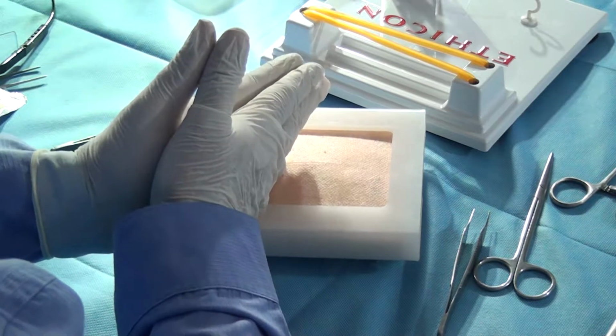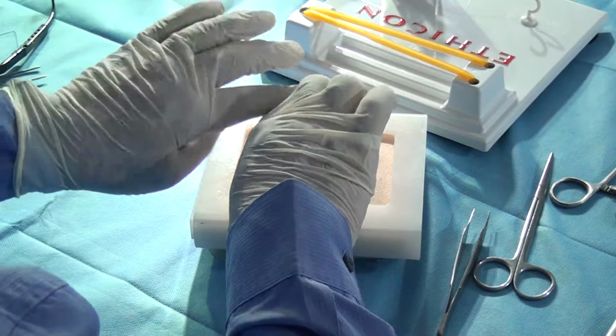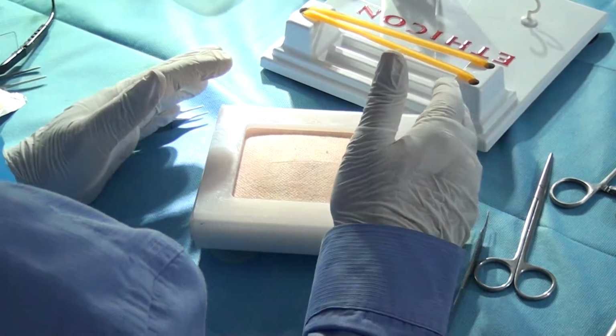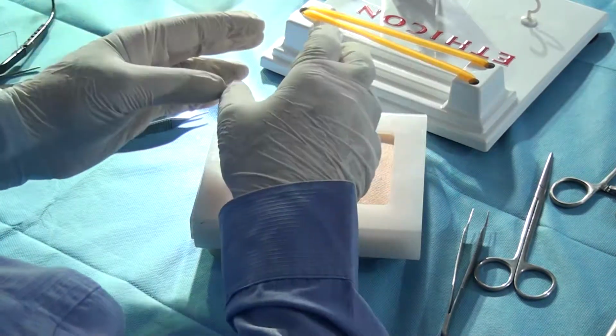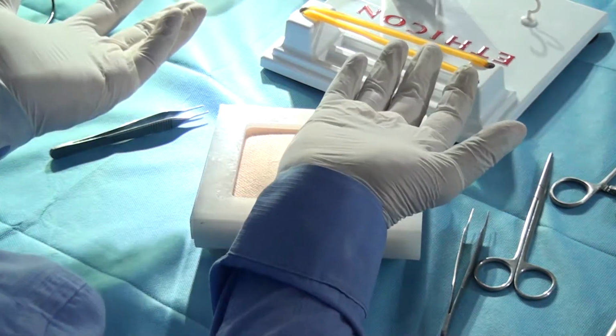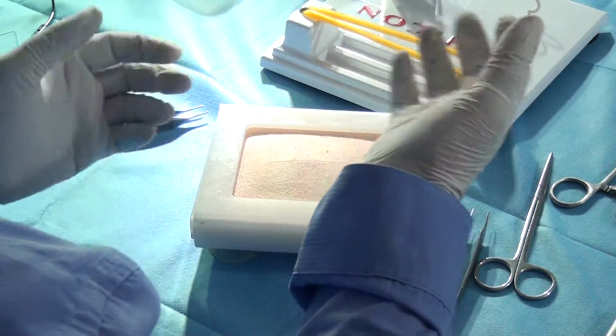Therefore, the table has to be at that level so that you can maneuver your wrist accordingly. And remember, I teach my students to do pronation and supination when they are doing nothing else. Therefore, tennis is a popular game among surgeons. Reason? Most of the surgery is done with pronation and supination. Everything is pronation and supination. For that, elbows need to be flexed. Therefore, the right height is the height where the elbows are.